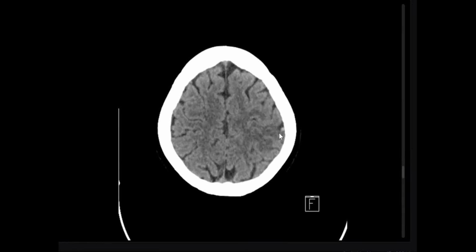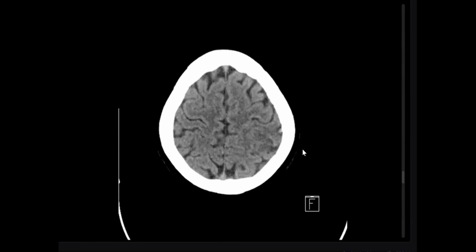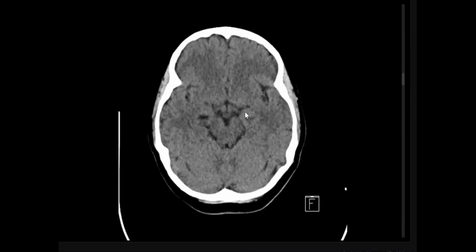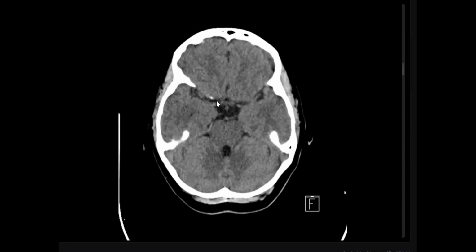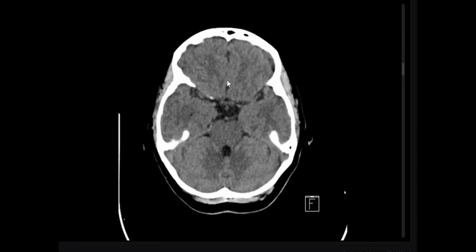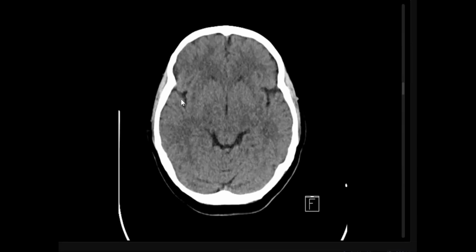What could this be, my friend? This is a superficial cortical vein causing infarct. Yes, it's a dense cortical vein sign. A dense vessel sign can occur in the artery, like the middle cerebral. Here it can be the basilar tip, and here the posterior cerebral. Even a dense vessel sign here can be the anterior cerebral. Anyone of the arterial system, and it can affect the proximal segments or even cortical segments.